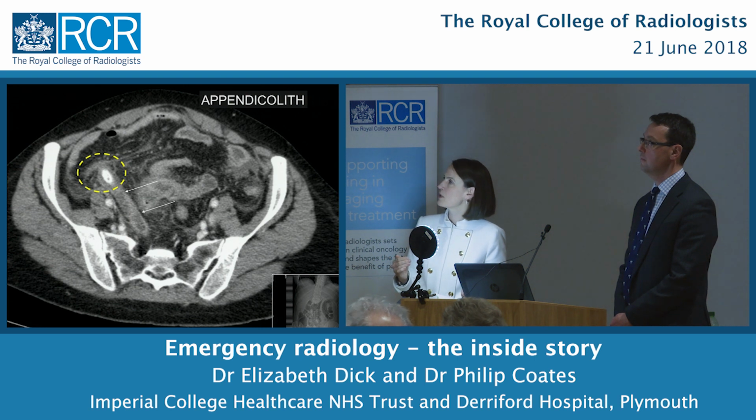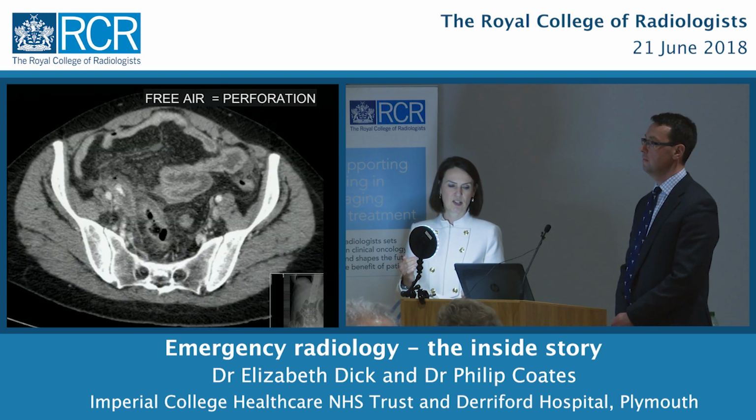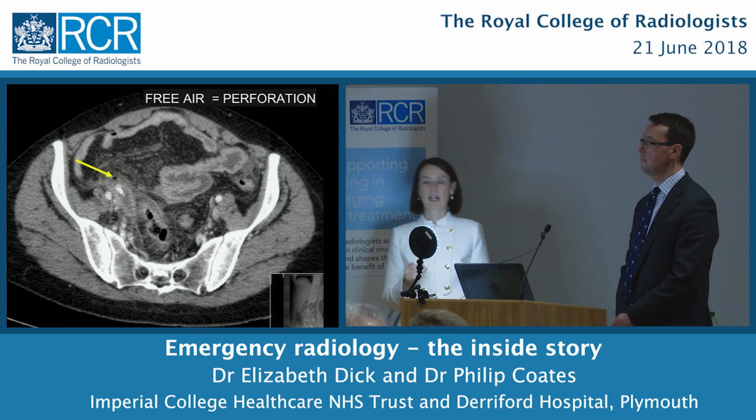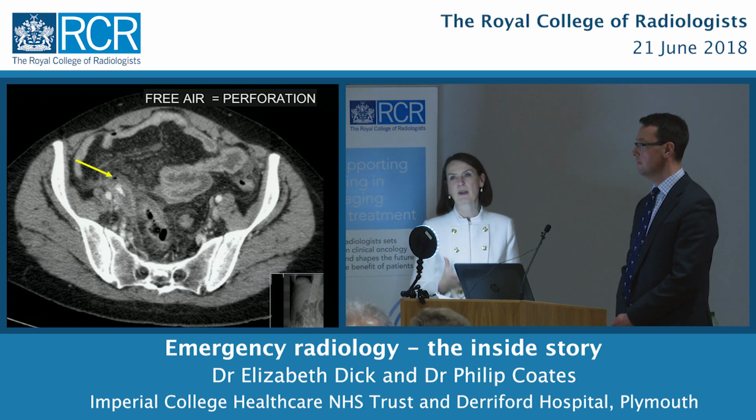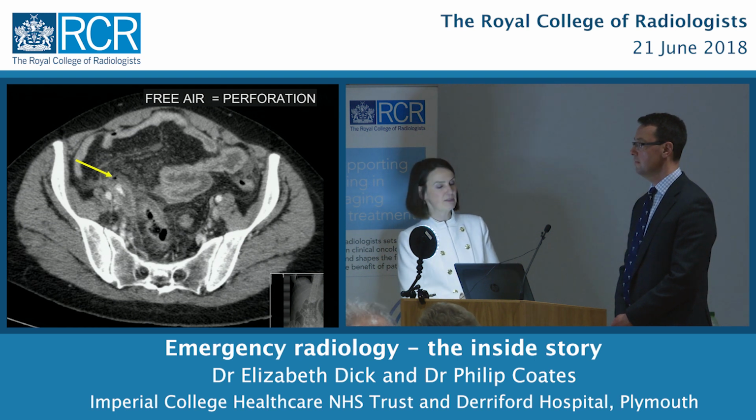So it's really important to answer the question, is there perforation? And we're going back to our same old principle. We can see a tiny black bleb of air, so there has been a perforation. That means the surgeon's going to treat the patient with antibiotics for longer, and their laparoscopy will be more extensive.